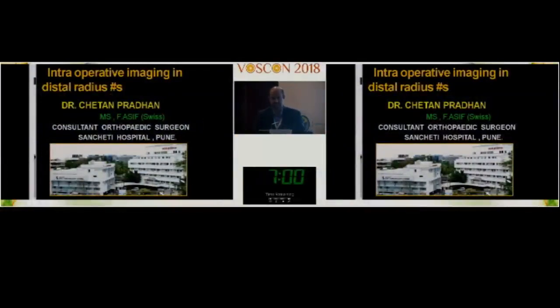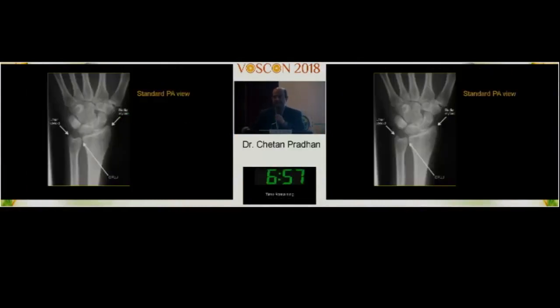This is a very short talk on what to look for intraoperatively. So all of us are quite familiar with this PA view of the lower end of radius, and all of us are able to practically see all the various radiological parameters here.